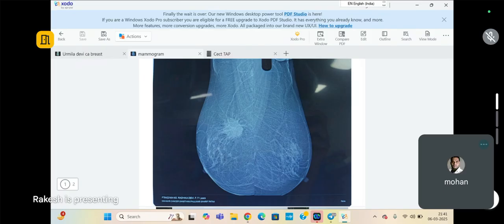One more question, ma'am. Based on mammogram, how do we classify the BI-RADS of the lesion? Suppose this is spiculated, we can say it is something around 4 or 5. But if it is not spiculated, a well-defined, round, lobulated, hyperdense lesion, every category has its features, like how they appear. Every category has its points: the asymmetry, the mass lesion, the nature of the lesion, the enhancement.